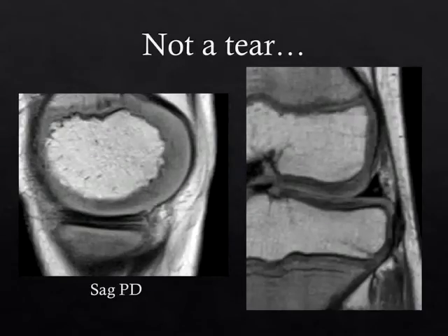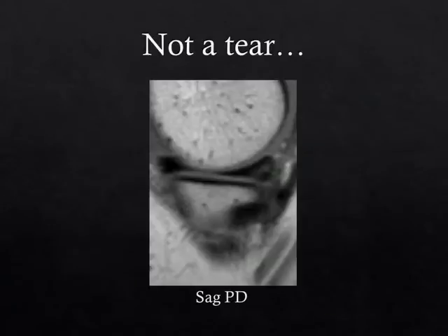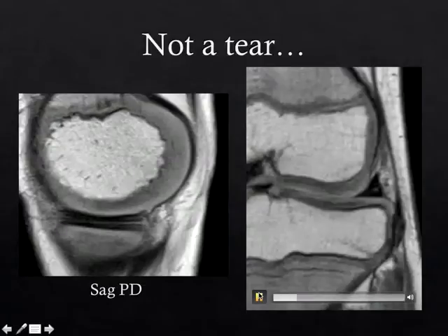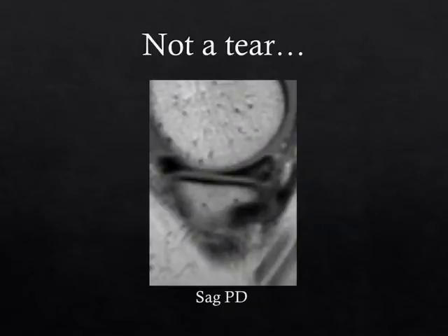I know this wouldn't be a problem here, but we've had several kids referred for arthroscopy for basically intrameniscal vessels. So up until the early second decade of life, the menisci are fairly vascular structures, and you can see perforating vessels within the peripheral aspect of the medial meniscus very frequently in kids. It's not a tear. It does not contact either the tibial or femoral surface. Sometimes on a proton density sequence, there is associated abnormal intrasubstance signal with these vessels, but this is not a tear. This is a very common location for basically vascular changes in young menisci.